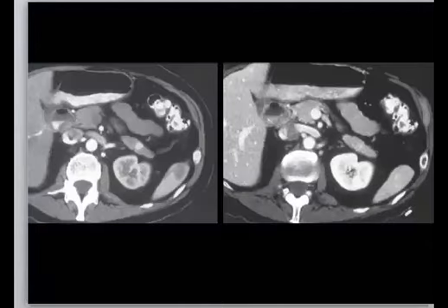Know it for differential. So this is another case. When you see CT, please go and check which phase you are in. So if you are in this phase, two phases, you are thinking that maybe there is one lesion here, right? And this lesion takes up contrast in the arterial phase, and it is indistinct in the portal.